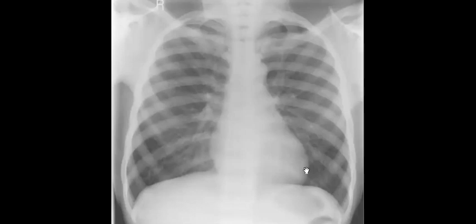No, it is not. I mean that if you want to show you this, it will be maybe more obvious. Search for something else. It is in the bone, yes. So what do you like the bone density? Again? Increase in density, yes. Then try to put this in the big title now, diffuse increased density.